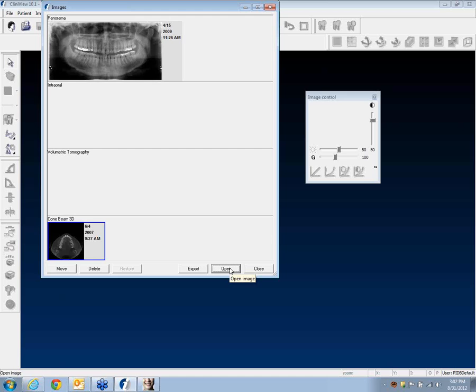This follows the protocols that are put in place for saving DICOM CT information. And when we open this, it's looking for some kind of file viewer that's able to deal with data that's saved in this protocol. There's a number of different DICOM CT viewers available, both on the medical end of things and on the dental end of things. Some of the dental ones are InVivo Dental and OnDemand3D. Those are two sets of software that are commonly marketed with our products, depending on where in the world you acquire those products. We're going to talk about InVivo today for the North American market.